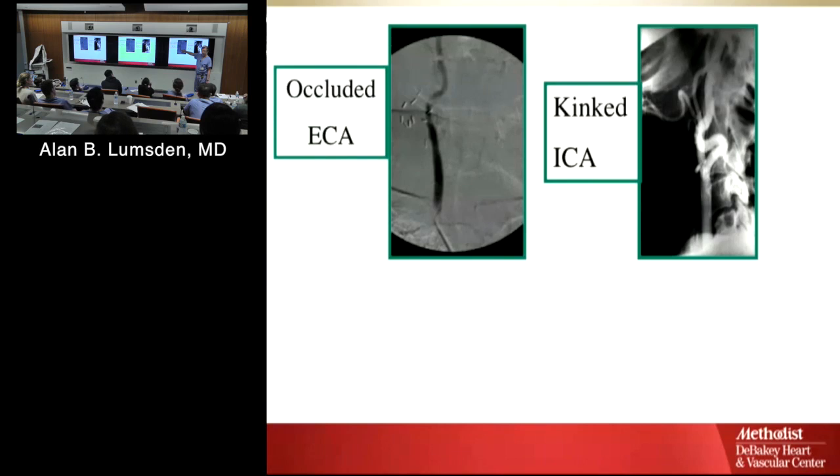All right, another one. Common carotid injection. So an end hole catheter in the carotid, injected. This is a test. Look at that picture and tell me what you see. I've already given you half the story. Okay, you see a bend. This thing doesn't project on that. No. Okay, you see a bend. What else do you see?